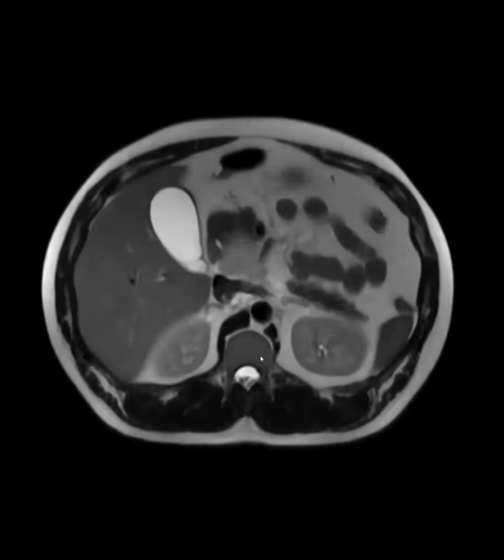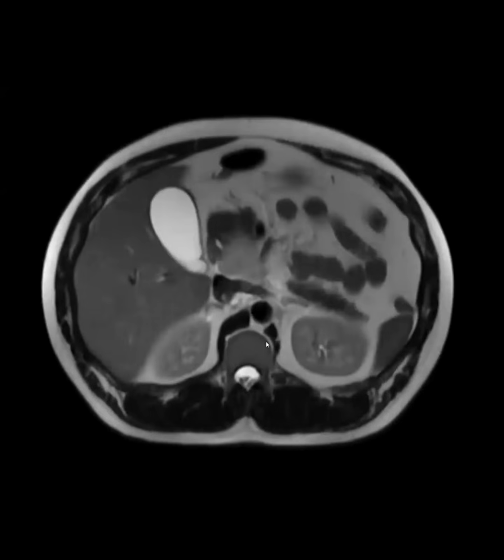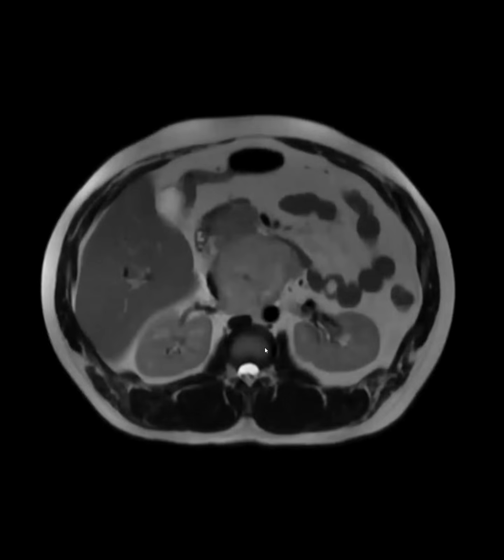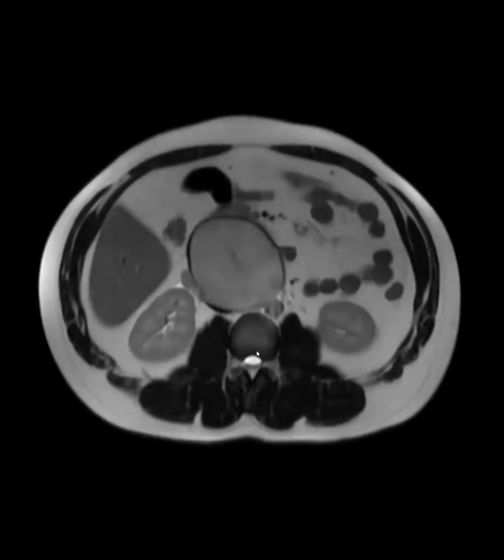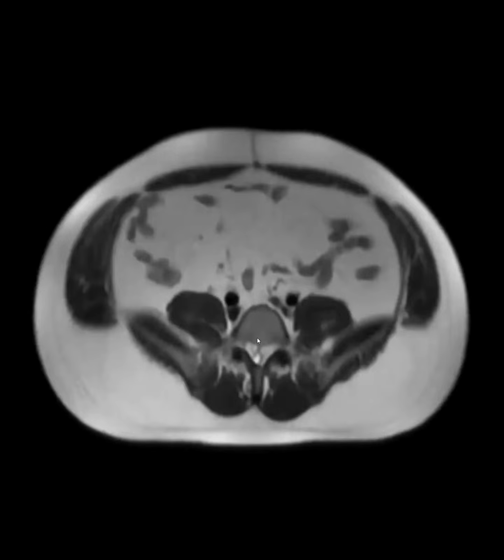And now I'm going to give you the extra clue. It's a young male. Oh, like seminoma, retroperitoneal lymph node metastasis. Yeah. So anytime we see big retroperitoneal masses in a young male, go look at the testes. Oh my gosh.